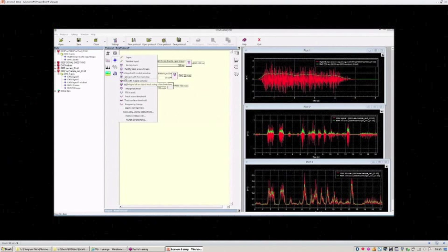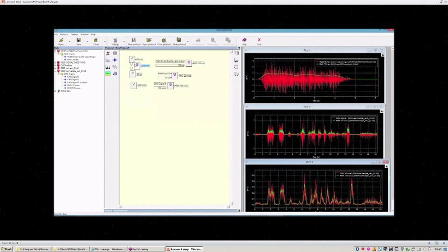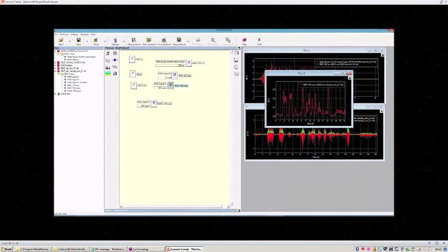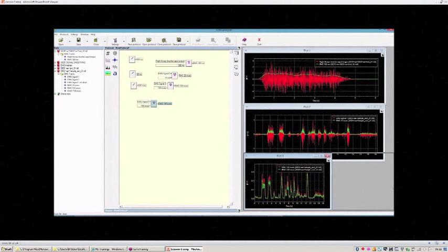Okay, so now I want to show you the differences between the root mean square algorithm and the integrated EMG. That is another algorithm available in the EMG blocks operator. I want to compute the algorithm with the same time window of 100 milliseconds we have chosen for the root mean square algorithm. And so in these graphs you can see the difference between the two algorithms.